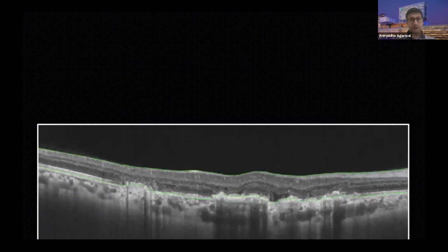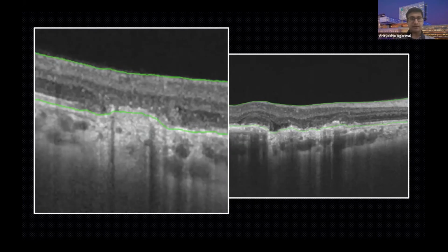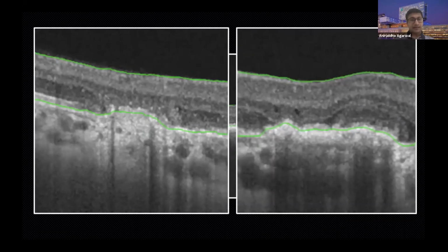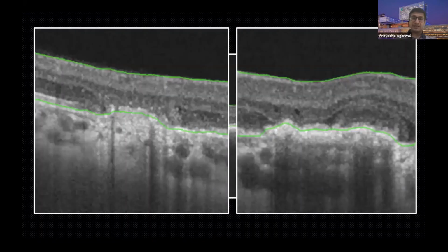The other aspect we know is that patients with uveitis, specifically choroiditis, have an irregular RPE. Under this RPE, it's very difficult to visualize the choriocapillaris. Sometimes there is a different reflectance pattern. You may have a hyperreflectivity under the RPE. The RPE itself may have a different height or thickness. And this is why if you have patients in whom you want to quantify the choriocapillaris, there may be problems, especially if the device uses an RPE offset.